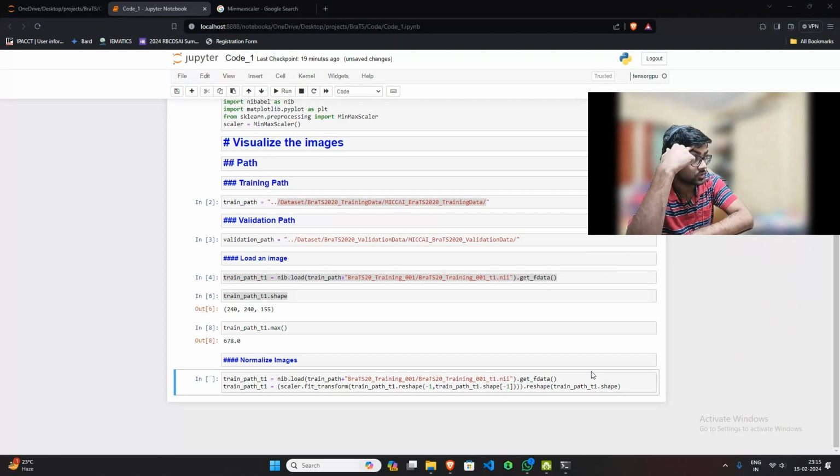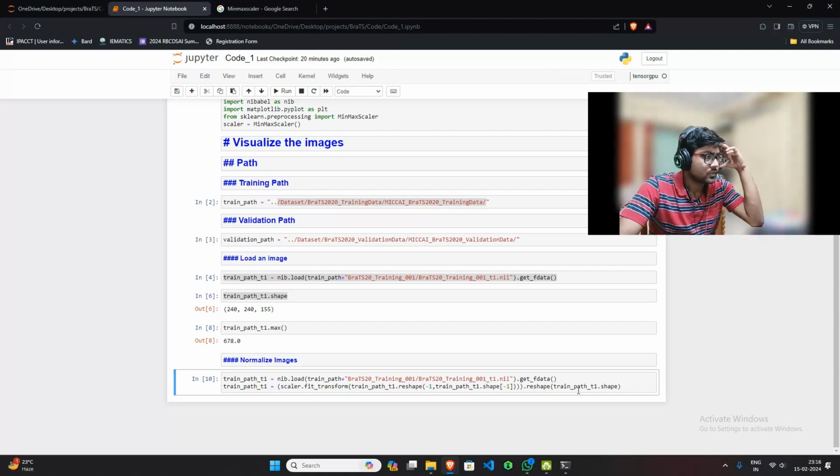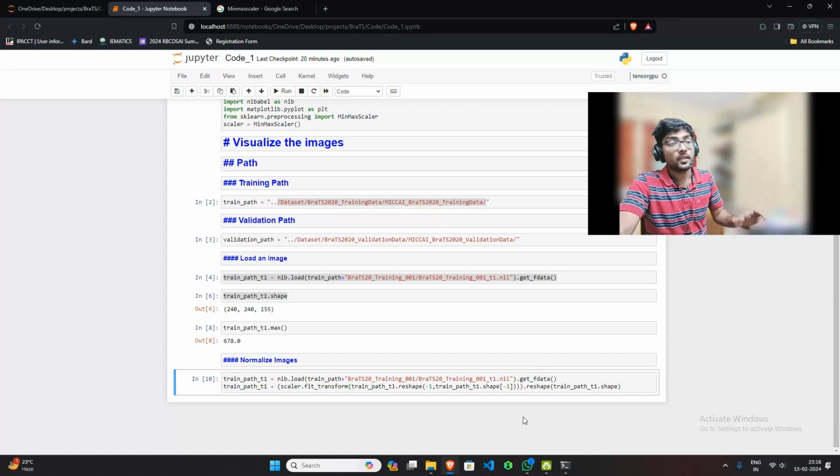I think this should work, right? I think there should not be an error. Let me check it, as it might not give any error, but there might be some problem inside it. I think it's okay. Yeah, I think it's okay. So that was the T1.